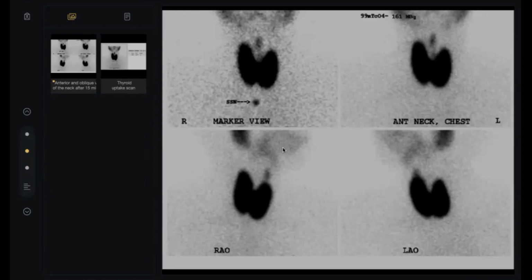Don't worry, tomorrow I will give a good background about thyroid. So your final diagnosis is Graves' disease, Graves' thyroiditis. Okay, thank you all so much. I have some questions. Toxic, but Graves. It is better to use Graves.